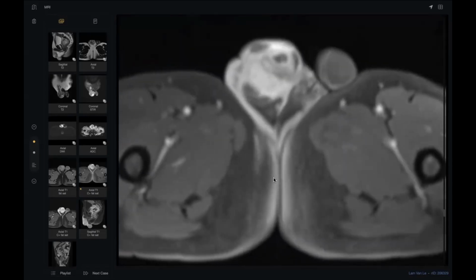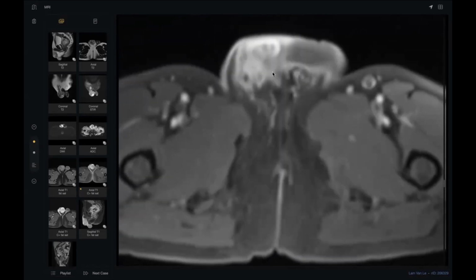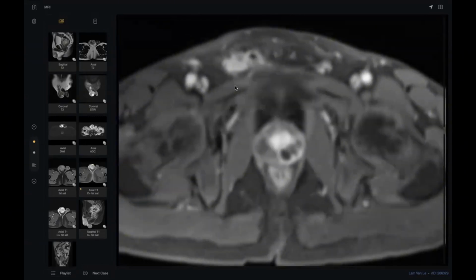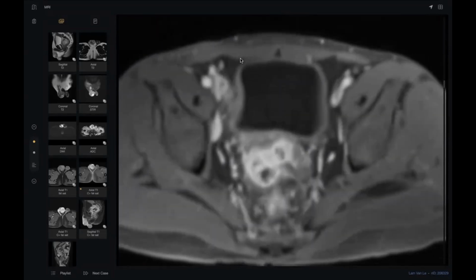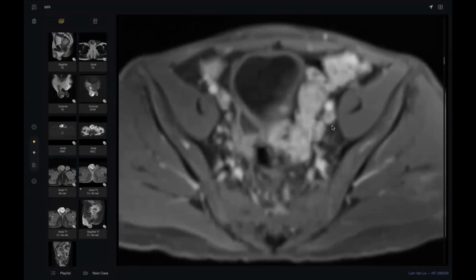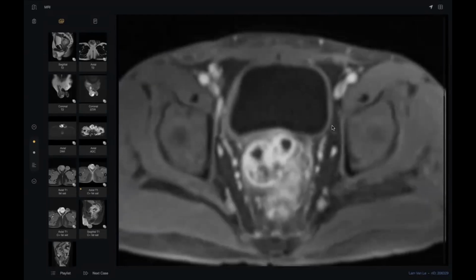How could the seminoma spread like this, without any infiltration of the skin here, at least, just along the cord, and it is very non-bulky, just enhanced, and coming here and then causing a huge seminal vesicle here, see?